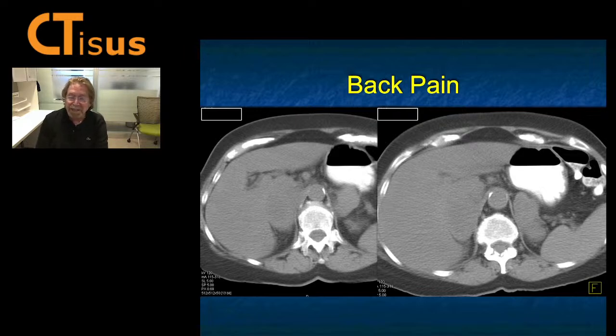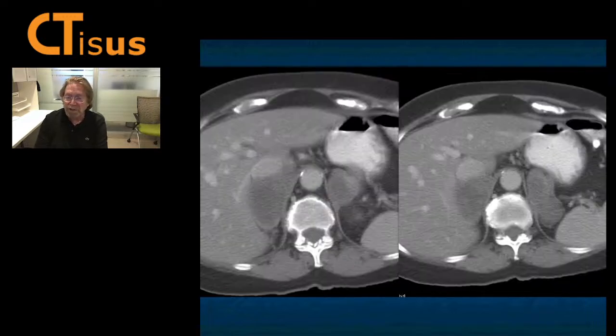Could it be ACC, primary adrenal cortical carcinoma? Rarely, only about 2% are bilateral, and surely not at this size typically. When you give contrast, the lesion enhances, but it's not hypervascular like pheo, so forget that. Could be mets. It's not adenomas, it's not bilateral myelolipomas. Well, what are we thinking about?